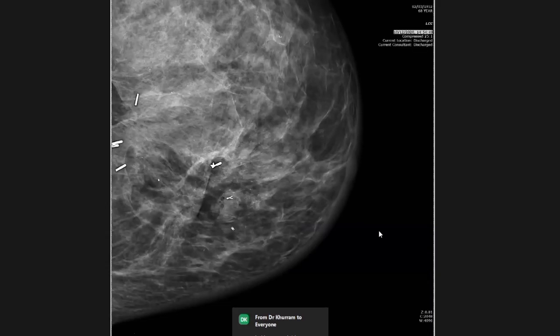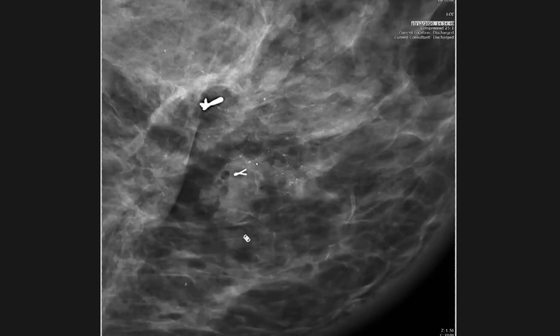But of note, I went back and looked at her previous mammograms, which we've got hard copies of from her previous cancer, and she did actually have a DCIS as well. So this actually on biopsy turned out to be DCIS histology on the mammogram, and I had made a mistake. I thought this was probably more a 5. If she hadn't had surgery before, I probably would have given it a 5.